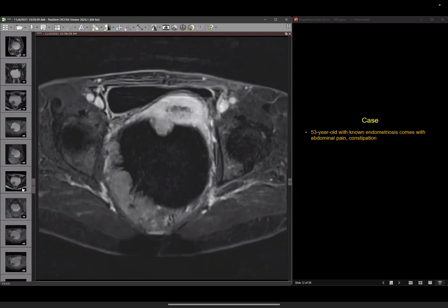And so now with this history, we know it's likely malignant. The question is, can you take it one notch higher? The patient has a previous history of endometriosis. So maybe the patient had previous endometriomas which are benign and now they've converted into a malignant mass lesion, endometrioid carcinoma maybe. Excellent. So in a patient with endometriosis who has an endometrioma, you can get cancers, and they are referred to as EAOC, or endometriosis-associated ovarian cancers.